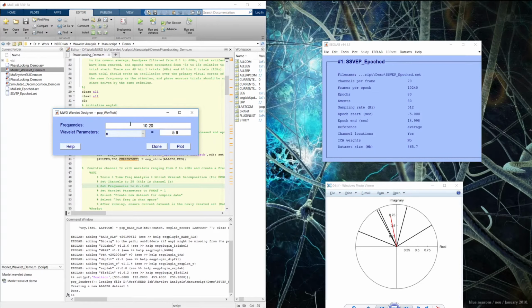For example, for this task, I'm mainly interested in the 6 and 15 Hz frequencies, so I'll take a look at those wavelets. Since the oscillations I'm looking for here are stimulus driven, I can expect a very narrow band of activity. So I'll want to define a very narrow wavelet in the frequency domain. But before I just jump into performing a convolution with a half maximum width of 1 Hz, I want to make sure that the time precision isn't going to take too much of a hit.